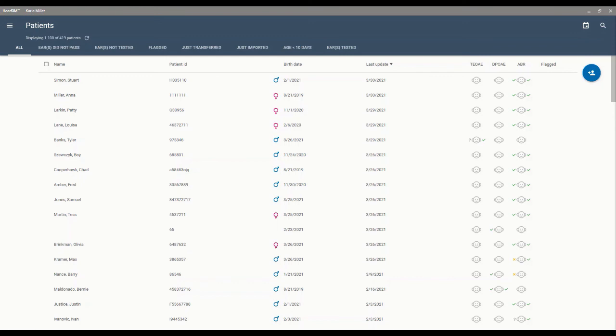Your easyScreen comes with pre-programmed protocols you can use for screening. They were defined to be efficient and with high sensitivity. We suggest that you stick with the default protocols. However, HearSIM does offer additional protocols to choose from and transfer to your easyScreen.